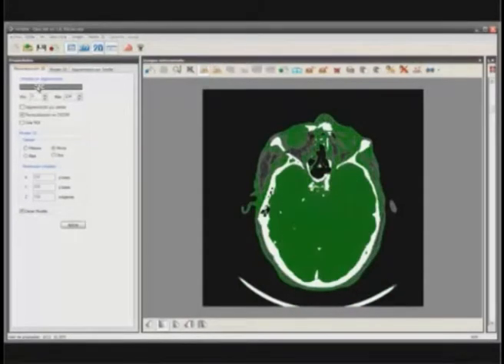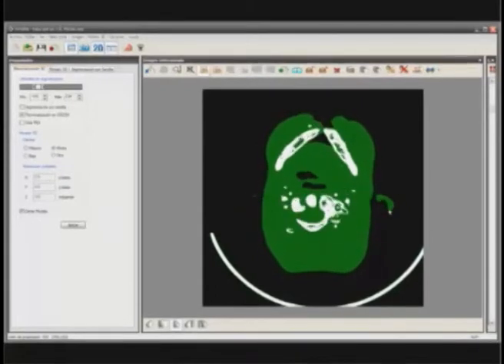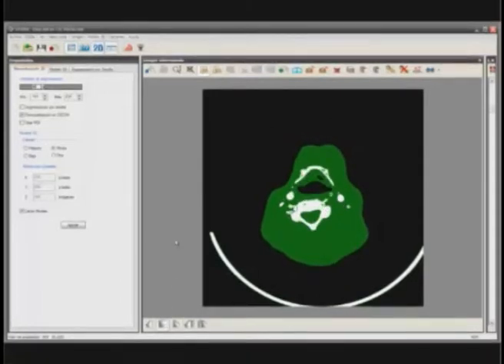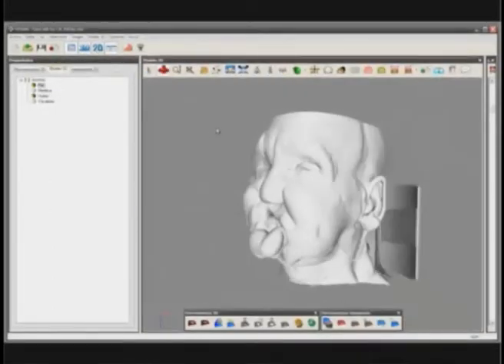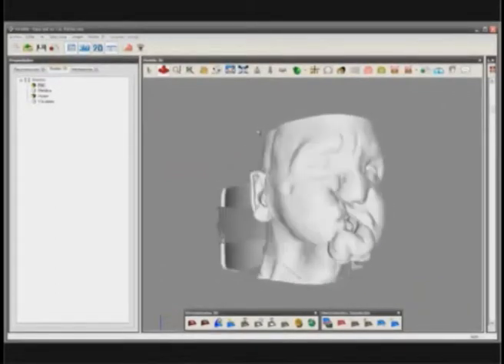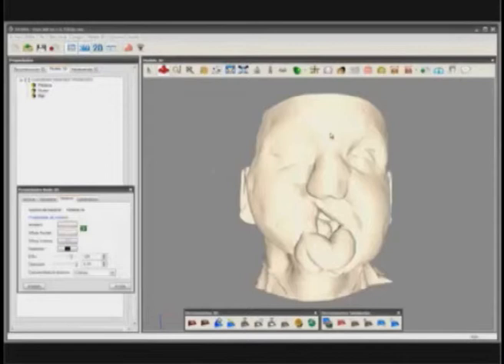We have just showed you the bone reconstruction, and if we change the parameters in the menu, as it is being shown now, we can see that the density of the green pixels now corresponds to the soft tissue. This way, we can do a tridimensional representation of the soft tissues of the patient, as it will be shown in the following clip. Here we can observe the large facial soft tissue distortion, the multiple reconstructions, and the improved outcome.